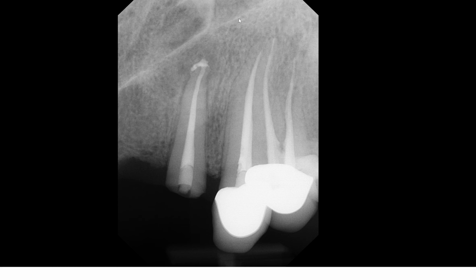What you see here is this oblique radio-opaque line. And what is that? Well, hopefully if you are my student that you should know this from my lecture, but this represents a nasal aperture. Okay, so this is a nasal aperture. If you want to call this a floor of the nasal cavity, that's certainly acceptable. So here's the nasal aperture. But if you look really carefully, you see this kind of radio-opaque entity going up above the nasal aperture, right? And I'm just generalizing the approximate location of the tooth.